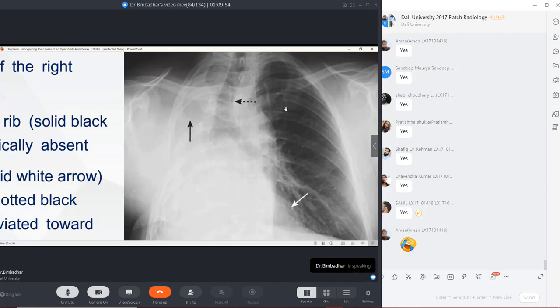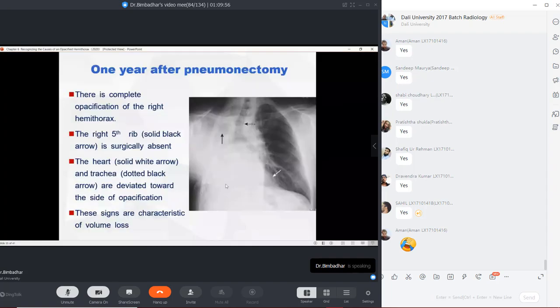So eventual tracheal pulling. See, why is there a mediastinal shift whenever there is a tracheal pulling? The heart and pulmonary blood vessels are moving over the trachea on the right side. So that's the reason there is a pulling, right? That is what I was talking about, the eparterial bronchus, and the structure of the pulmonary anatomy there. Do you remember that point? So that's the reason whenever there is a tracheal deviation, there will also be somewhat of a mediastinal deviation too, a mediastinal shift.